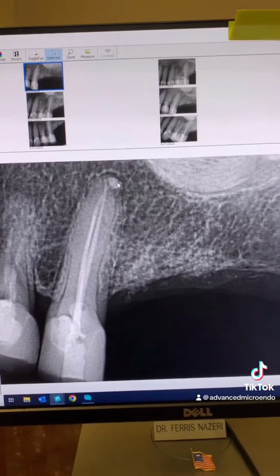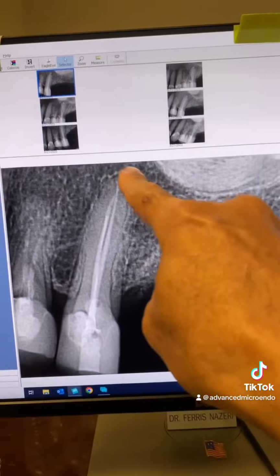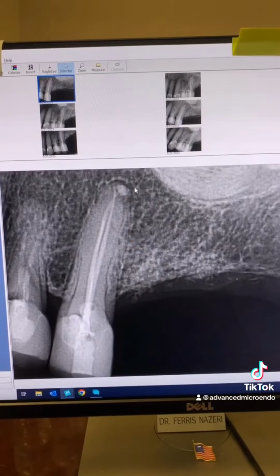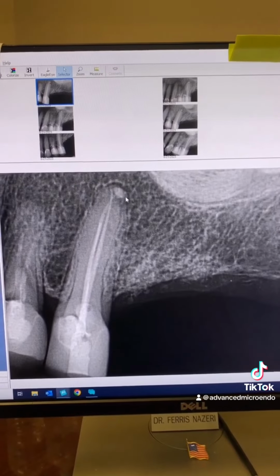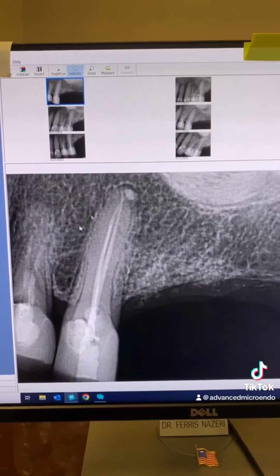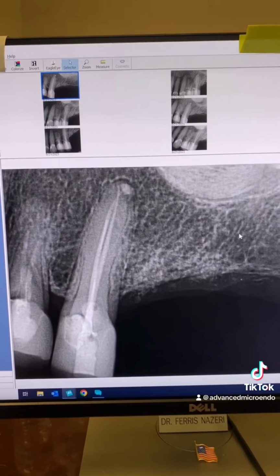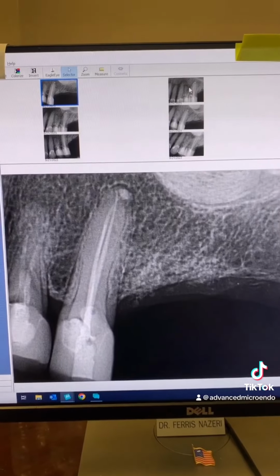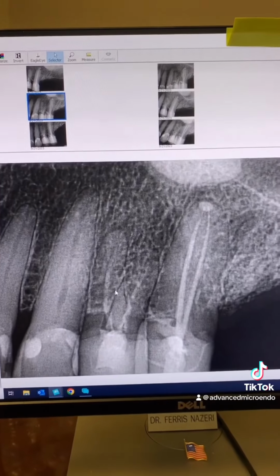All right, so that tells me that this is not a periapical radiolucency associated with an active infection. This periapical radiolucency used to be much larger and now has gotten much, much smaller. So this is not an infection. This is healing. So this is how you go about diagnosing. No shortcuts, and you do it thoroughly. As far as tooth number 12 goes, look at this root canal.